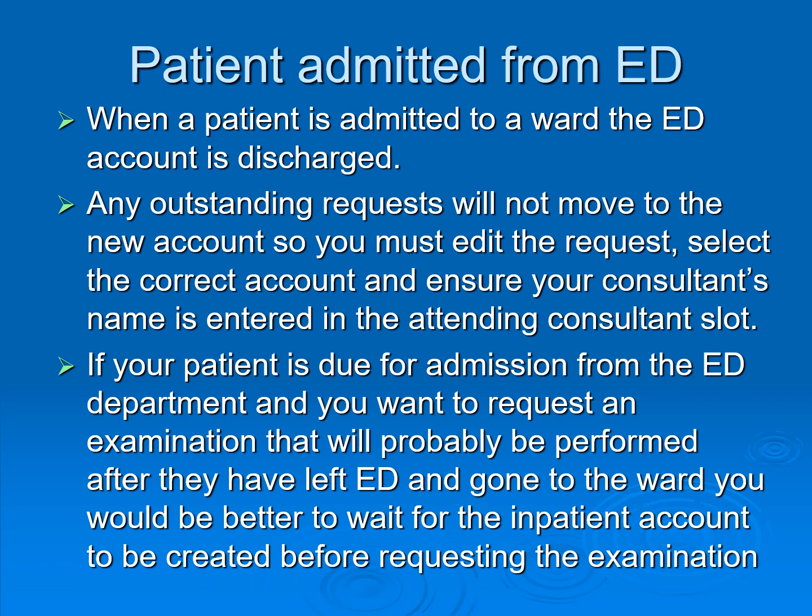Please note this carefully. When a patient is admitted to a ward from the ED department, the ED account is discharged. Any outstanding requests will not move to the new account, so you must edit the request. You select the correct account and ensure your consultant's name is entered in the attending consultant slot.